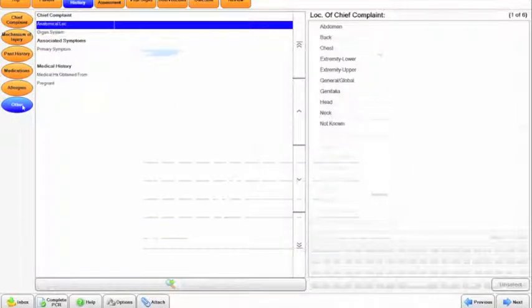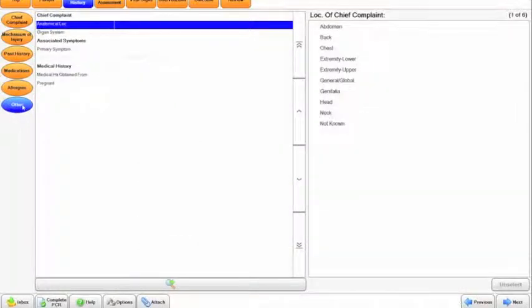The final tab is the Other tab. All of these items in this particular menu are NEMSIS requirements. I know a lot of the times we feel like we're inputting things twice, and it seems repetitive, but the national database, the state of Illinois, have different reasons for different study purposes of why they ask what appears to be multiple questions about the same types of topics.